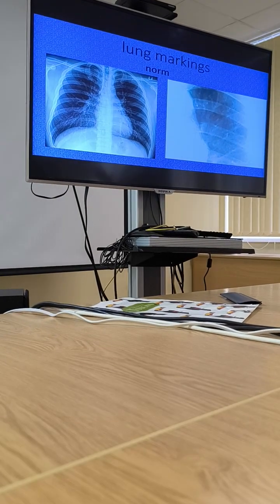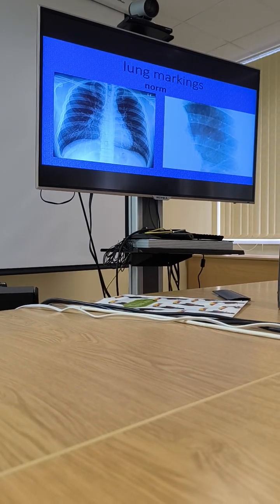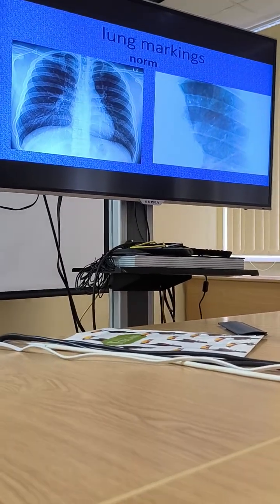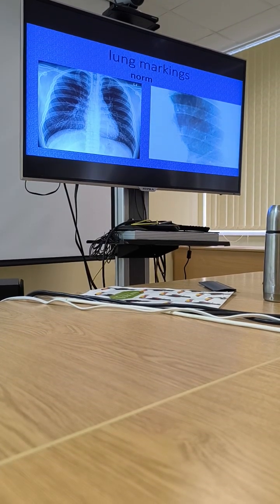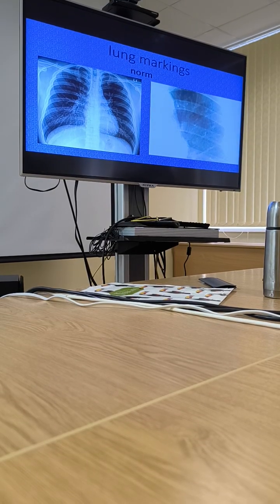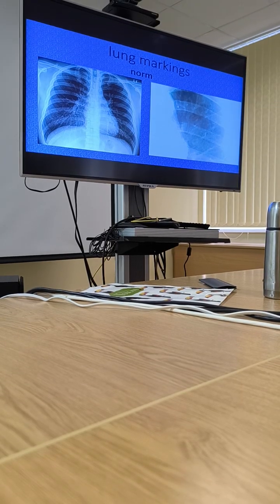And lung markings. This is really complicated and tricky because to feel that lung markings are abnormal, first you need to have an understanding of what is normal. And to have this, you need to have experience. But again, I just want to introduce to you just basic patterns which can be representative of some diseases.